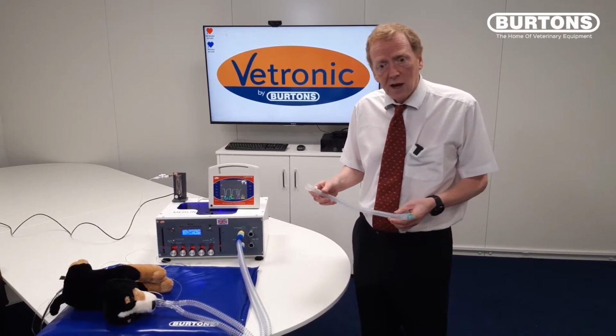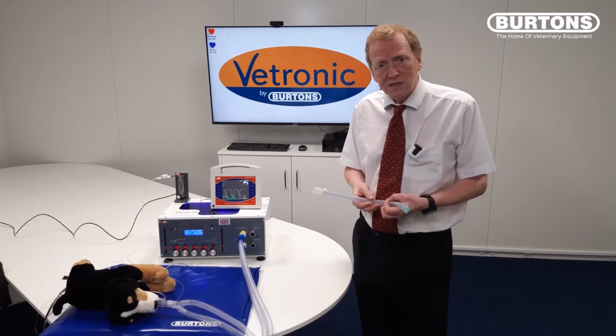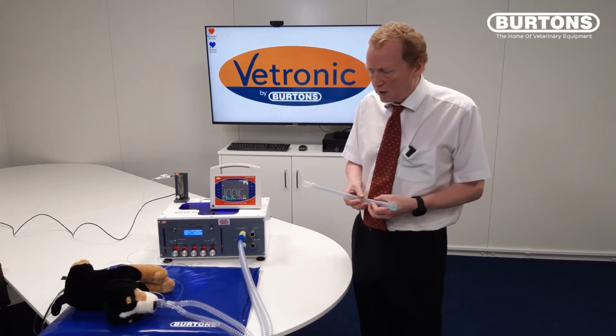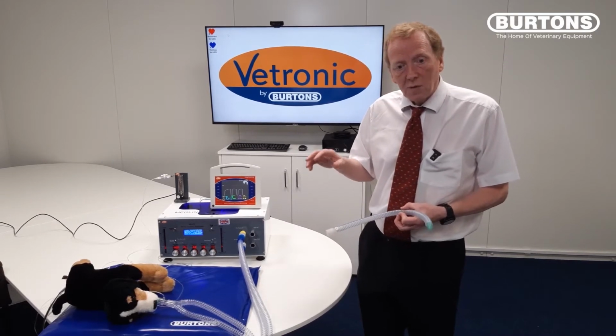Although this would appear to be quite a large volume, and indeed it is, it's unlikely this would be accidental dead space. But if we scale that down to a cat with a tidal volume of 50 mils, we're looking at the equivalent value of only 10 or 12 mils of dead space, which is easily achievable with some HME filters or additional bits of connected airway. So we're going to use this as an example of the effect of dead space.